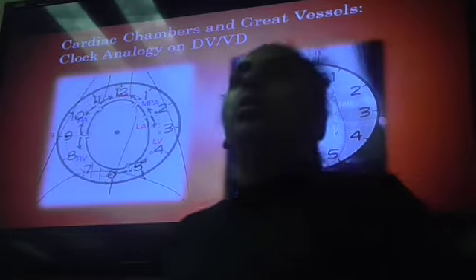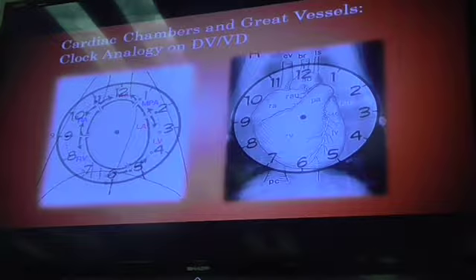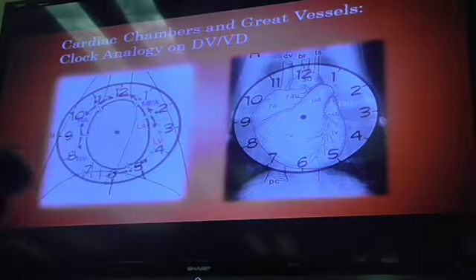But left auricle, when enlarged, will represent any left atrial enlargement, all right? Well, will represent most left atrial enlargement. Let me correct that. So the next in line is going to be left ventricle, then right ventricle, right atrium. See how I just went in that merry-go-round? Okay? So just kind of remember your merry-go-round, and then you guys start getting yourself together.